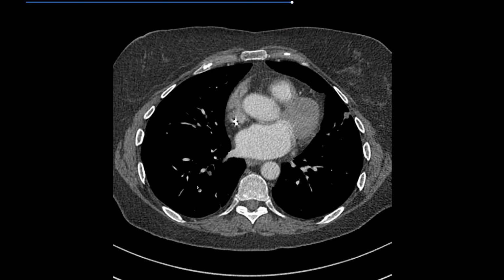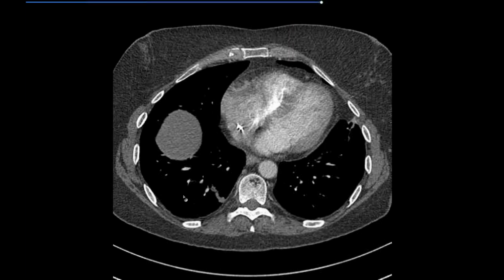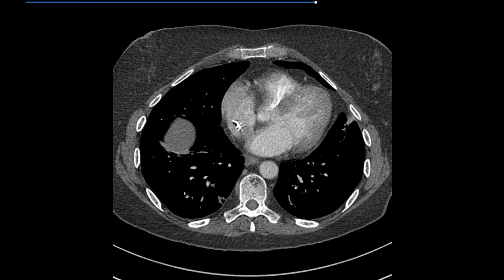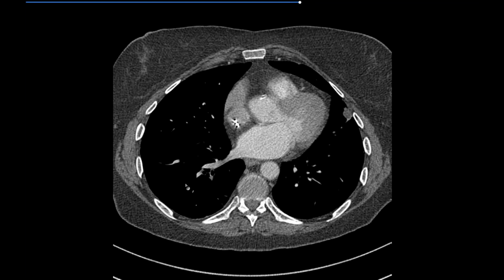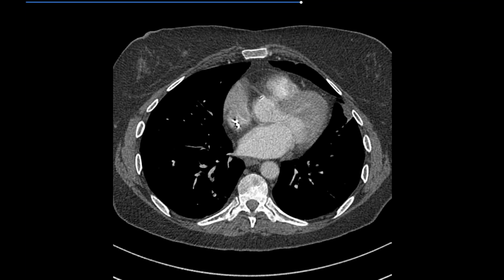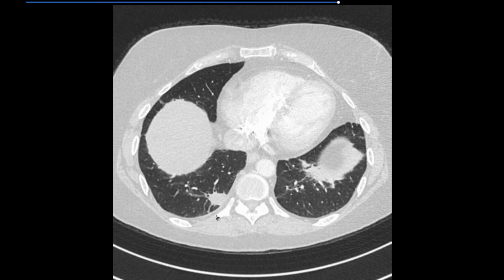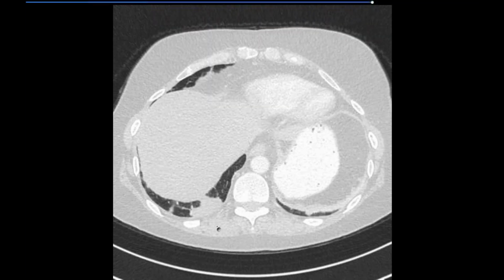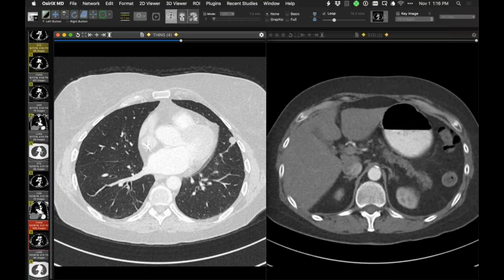And it's now just, I suppose one could talk about fibrotic or thrombofibrotic occlusion of a vessel, even though it's not thrombus. But just a nice description and demonstration of pulmonary embolism, what it could look like in 2 months in terms of its evolution. And again, a reminder that not all vessels recanalize. This one is just shrunk down to nothing and is undoubtedly going to remain there forever. These infarcts have diminished just slightly in size, but perhaps they'll stay this way forever now, perhaps. So just a nice demonstration of findings in pulmonary embolism.